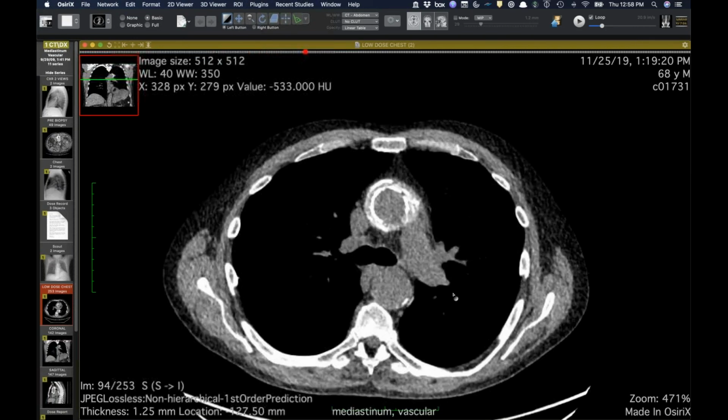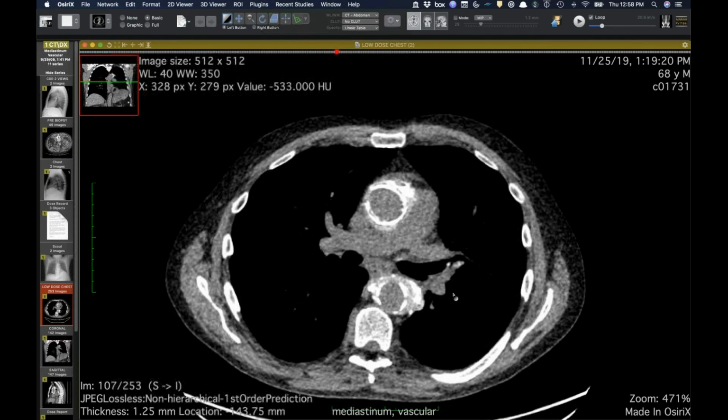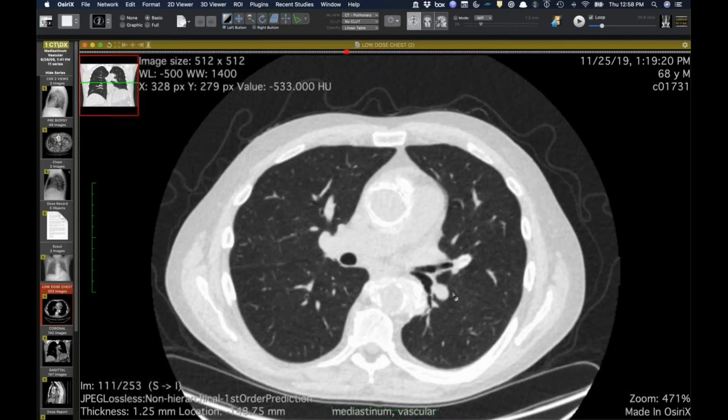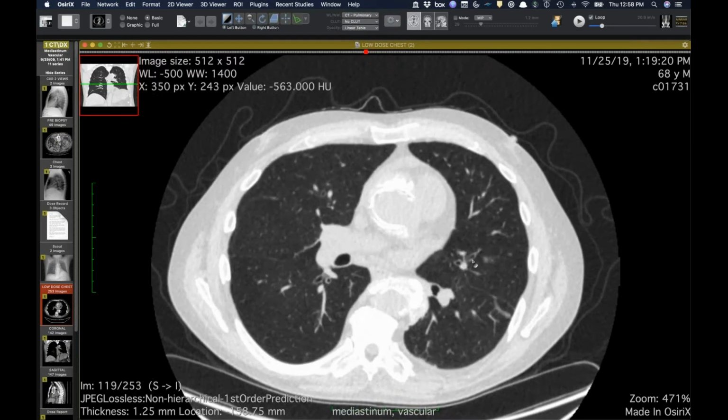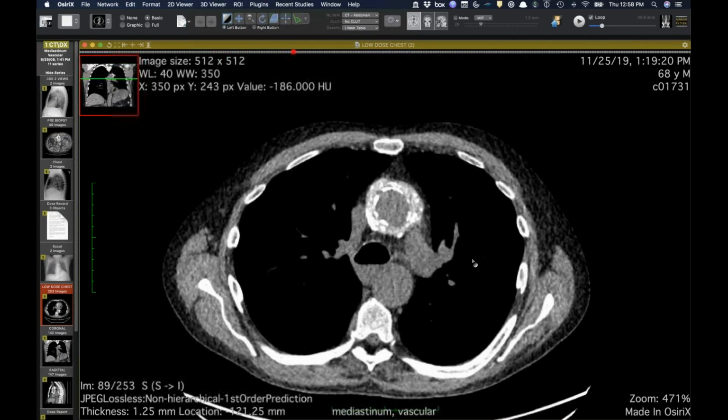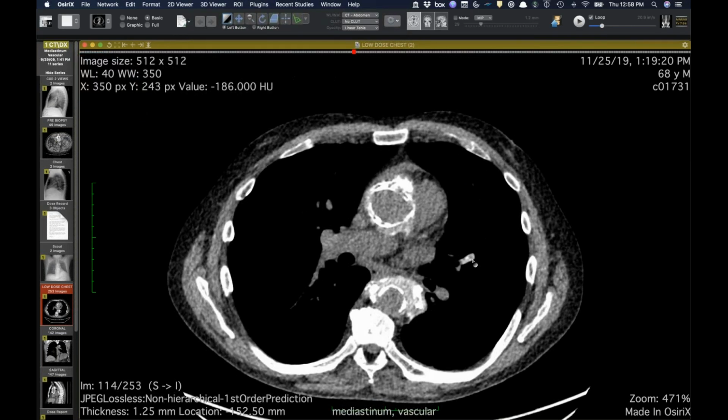That's a pulmonary artery, or is that a vein right there? I think that's an artery. It's right next to that airway, I think. Same thing to a pulmonary artery. Yeah, maybe Takayasu could do that. Yeah, that's weird. But then again, it doesn't tie into the belly.